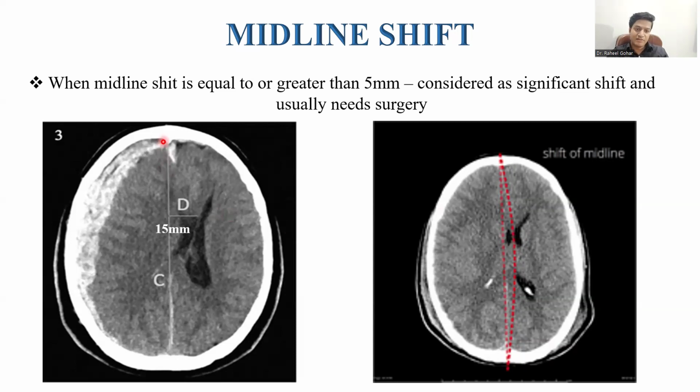Here you can see again we have drawn a line, and this is the septum pellucidum, and you can see that it is nearly 15 mm. It is very significant.